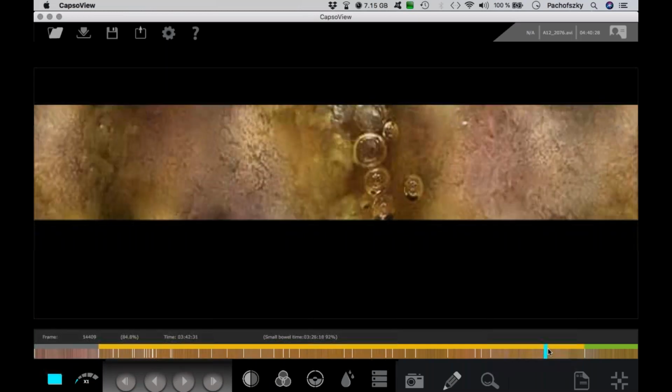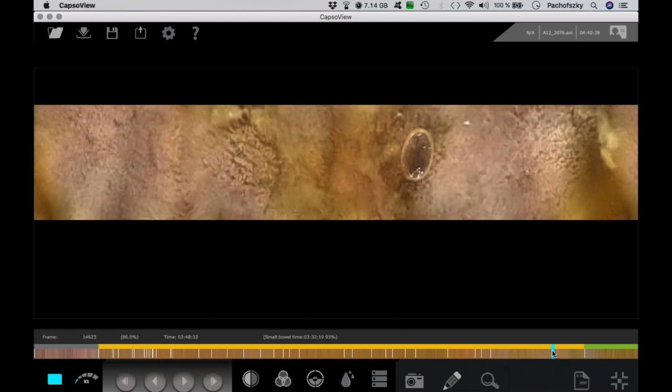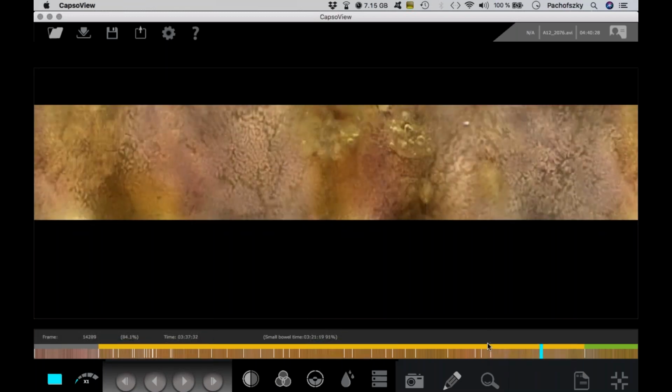Also here we are distal, we are near the ileum or in the ileum, and here you can see it's looking nearby normal in this area. And if you're going up a little bit, so the typical lesions of a Crohn's disease.